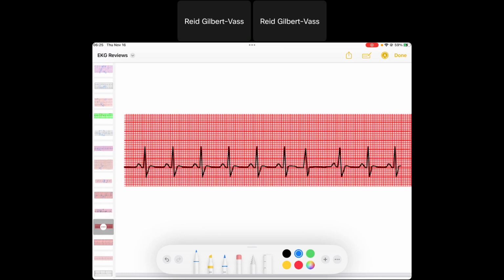All right, so we've got normal rhythm here, and then we've got this early beat. So let's take a look at the early beat. The QRS looks the exact same as the previous one, so we know it's probably coming from at least through the His-Purkinje system. And we've got normal P waves previously, but this one doesn't have a P wave in front of it. So without a P wave in front of it, but a narrow QRS that looks just the same, it's still using the His-Purkinje system to create that narrow QRS. So this must be a junctional escape beat or a premature junctional contraction, PJC.